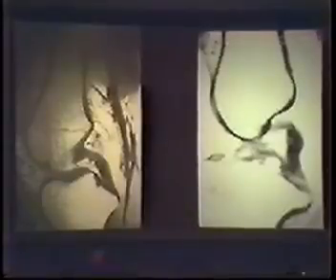Now, one thing I'd like to point out is that this is the normal configuration of the posterior cruciate ligament. This is an abnormal configuration. Look how buckled it is. Sometimes, if you have a stretched anterior cruciate ligament from chronic disease and an unstable knee, the anterior cruciate ligament can look entirely normal. But either a totally torn anterior cruciate ligament or a lax anterior cruciate ligament will allow the tibia to move forward with respect to the femur.